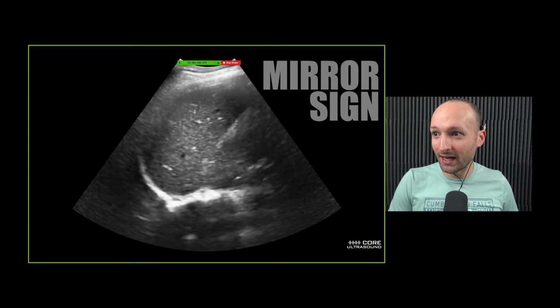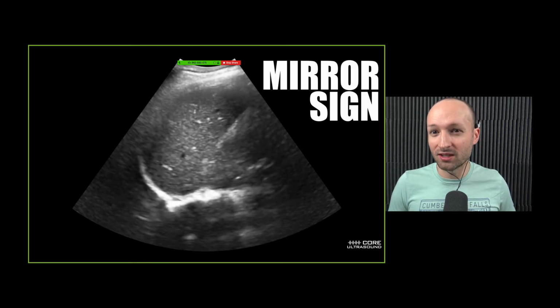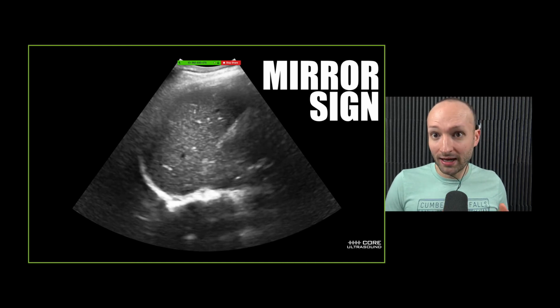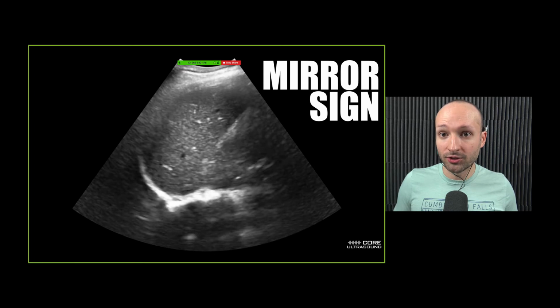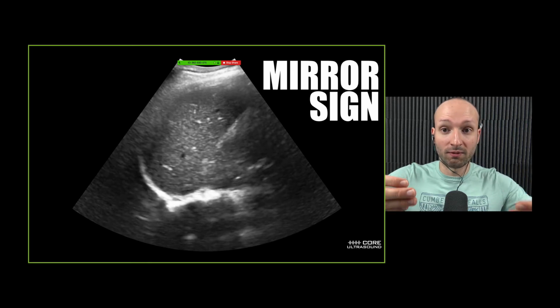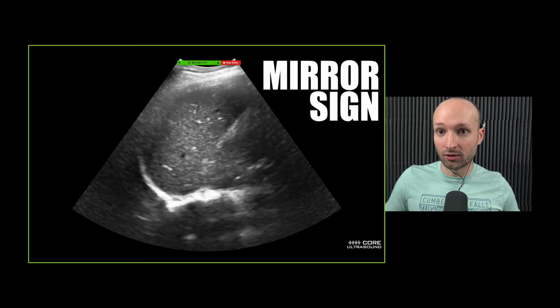Let's talk about my less favorite one, which is the mirror sign. Now, remember I mentioned that when you have air, it makes sound bounce off of it, right? And remember I also mentioned that the way the ultrasound machine finds things is it sends out sound waves and it waits for reflections to come back, right? So anything that reflects sound is going to be white on ultrasound.